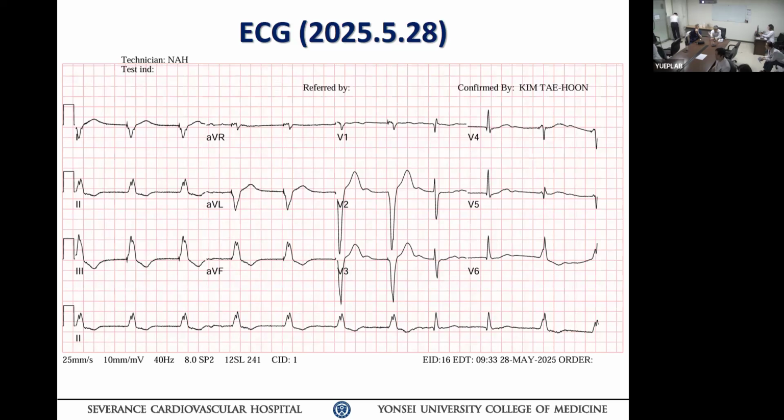So I'm telling you all about these potential explanations here. In my eye, it looks like the rate varies a little bit, so I would favor rate response, so far a single chamber pacemaker. Okay, what I see, I don't know, it could be dual chamber, but the ECG manifests as single chamber. Then what happened here? This one here.